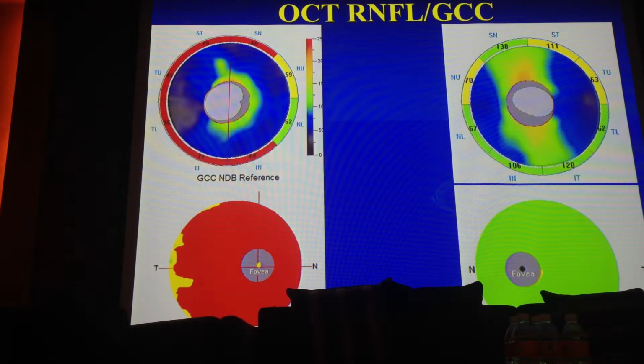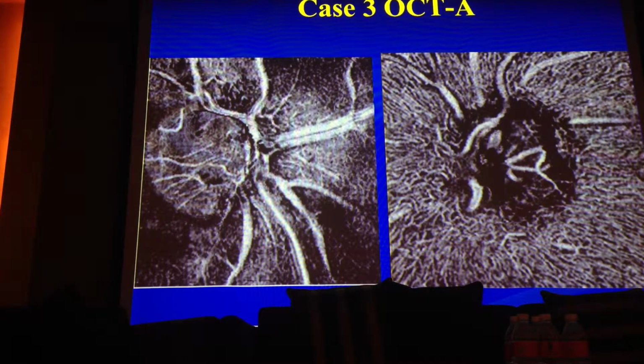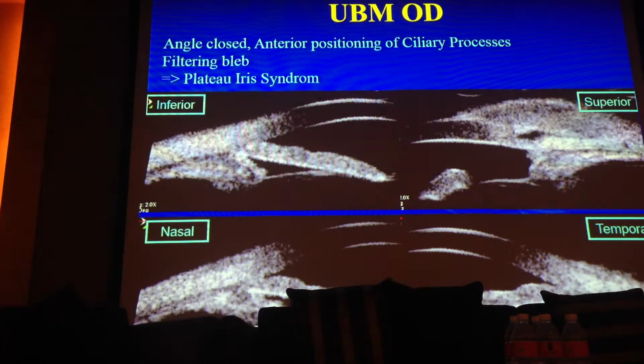And so we have tried to raise this. You can observe the difference in the vascularization around it. So all things are correct. We have one eye with very dense glaucoma, very advanced glaucoma, and the other eye with quite no problem. So due to the angle closure aspect of the gonioscopy, we practiced UBM exploration.